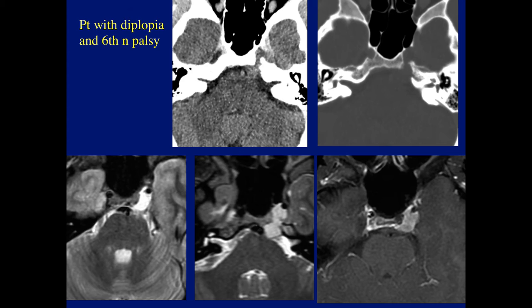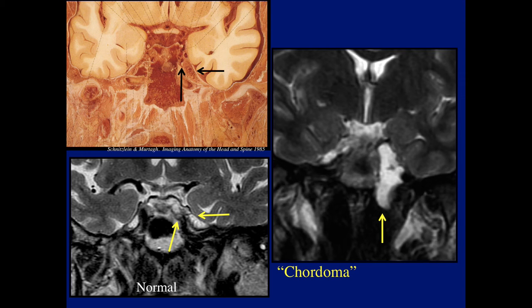What lesion is usually bright on T2? Besides the cystic schwannoma? Venous malformation? Possibly. What lesion can occur in the clivus? Correct. As Gino mentioned, and Ben, we felt that this most likely was a chordoma.